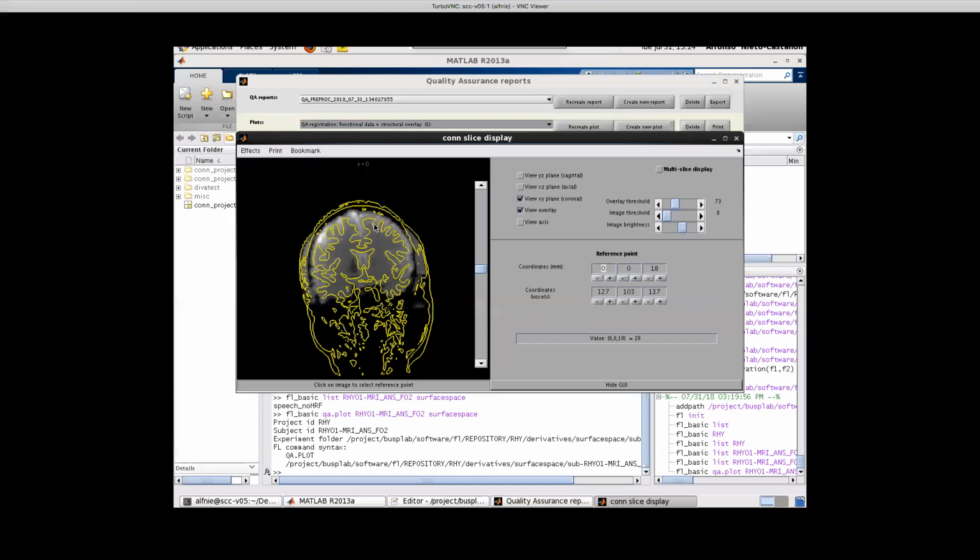And that plot, I will add it so that it is created, because it will allow you to catch cases where the structural data and the FreeSurfer generated surfaces have been, for any reason, put out of correlation. Those two things should always be in line.